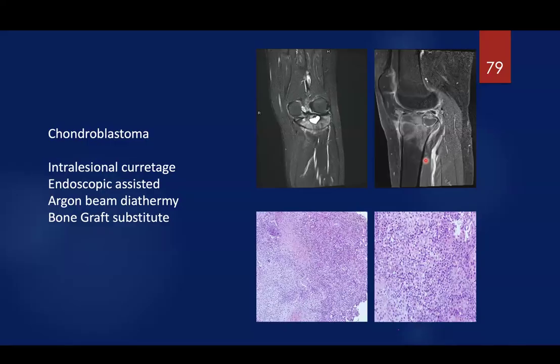It's contrary to what you think. Clear cell chondrosarcoma does not give you bone marrow edema, while chondroblastoma, like this lesion, gives you too much bone marrow edema. And again, chondroblastoma gives you the typical appearance of chondroid and fibrous tissue and chicken wire and stuff like this.